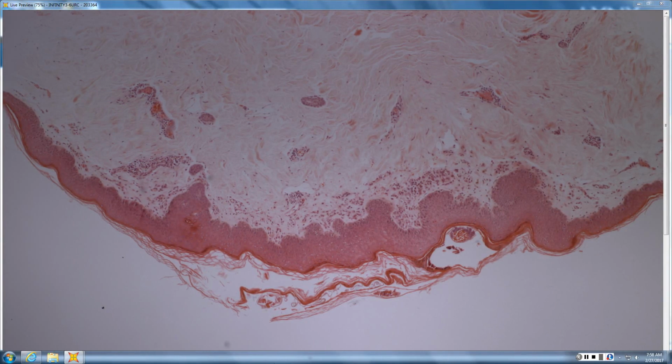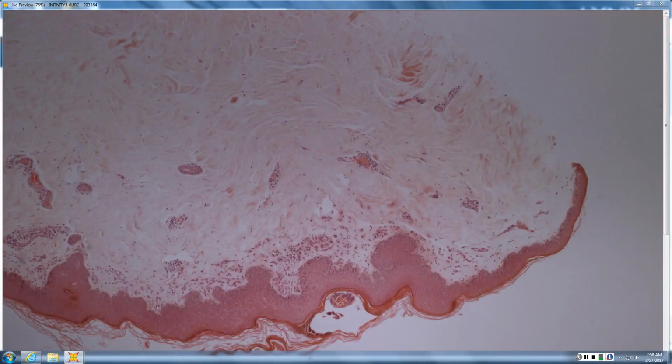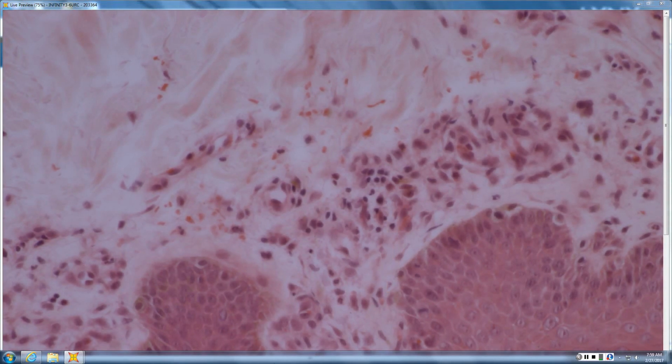Okay, go ahead. So looking at the stratum corneum, it looks like maybe some pigtails in the most superficial layer. So in the corneum you have little twists and pigtails, which tells you that this patient has scabies. And if you look at the top and at what is being recruited, what kind of cells, you have these reniform nuclei with ample cytoplasm, eccentric nucleus. How do you think those might stain? CD1a, positive for Langerhans.